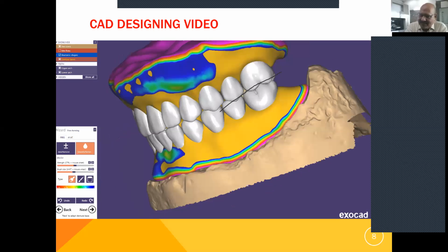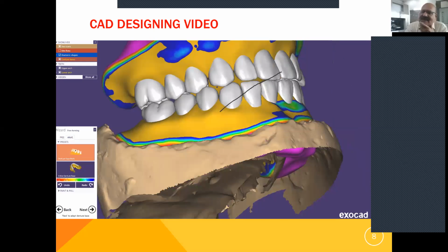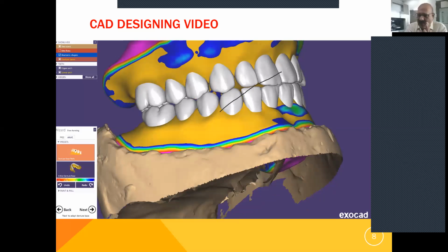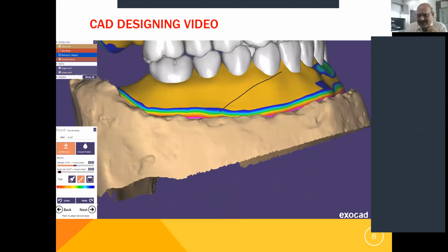The teeth can be altered in height by fixing with modeling wax. And then probably we will use that as a pre-op. So the computer allows us to copy everything according to the pre-op, the jaw relation in particular. Okay.